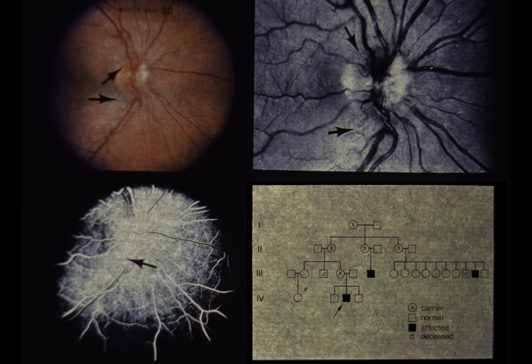Visual acuity was 20/60 right eye and 20/200 left eye. Color vision was diminished bilaterally, and there was a left afferent pupillary defect. Visual fields showed bilateral cecocentral scotomas. Upper left. The right optic disc is hyperemic. The nasal portion of the disc is obscured by a white congenital glial remnant. Arrows point to dilated telangiectatic vessels.